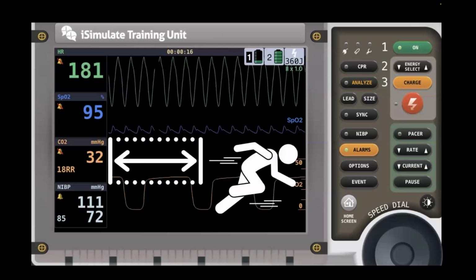How about this one? Nice, wide, bizarre, regular rhythm, but it's going fast. It's definitely above 150, and 150 is kind of the rhythm number we look for in adults. When it's above 150, we really want to say, "Hey, I need you to take a peek at this." So it's wide and fast. Remember in the last video we talked about how, in 2.0, it was wide. We assume it's ventricular until proven otherwise because it's going against that normal vector, so it takes more time. It's like those trout swimming upriver. So this one would be VTAC.